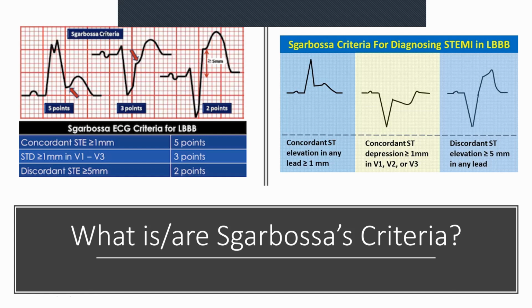So let's take that one step further. You get a left bundle branch block, and in some areas, you see up. Chances are quite high. You see down, in other words, your QRS complex is inverted and your ST is starting off lower. That's a bad sign.